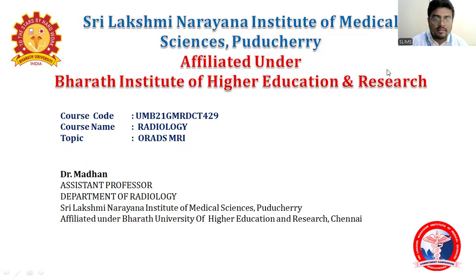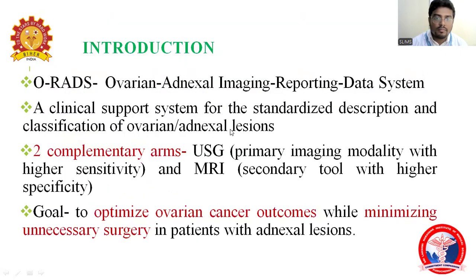Today, we are going to discuss about O-RADS MRI. Introduction. What is O-RADS? O-RADS is Ovarian Adnexal Imaging Reporting Data System. It is a clinical support system for standardized description and classification of ovarian and adnexal lesions.